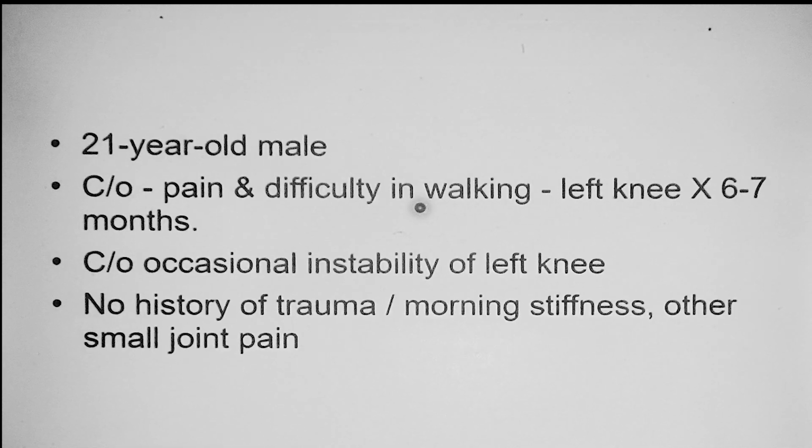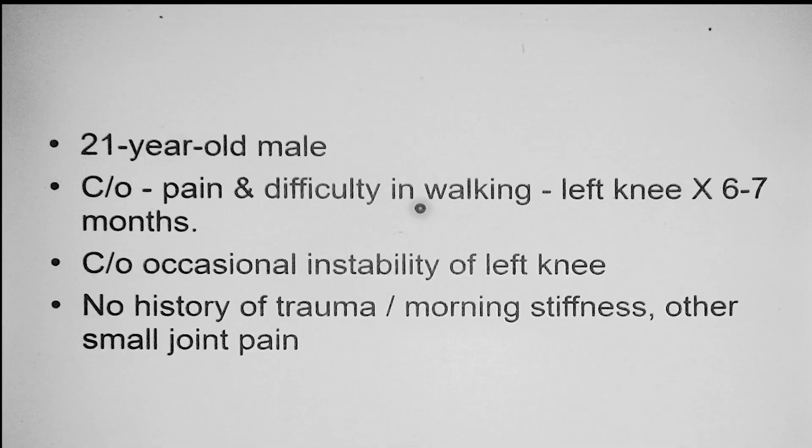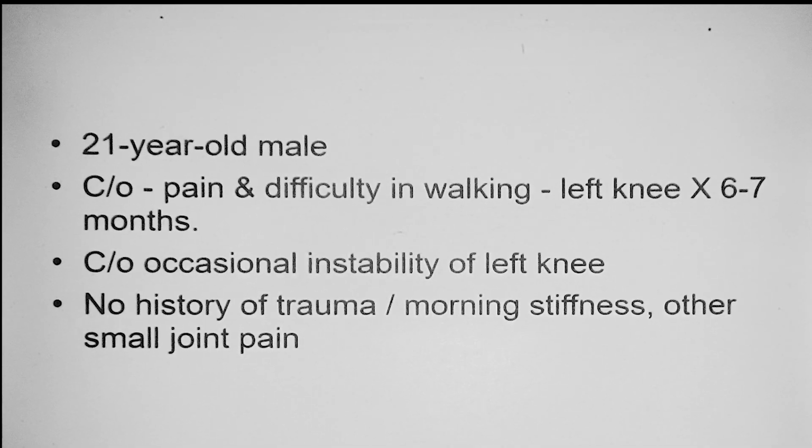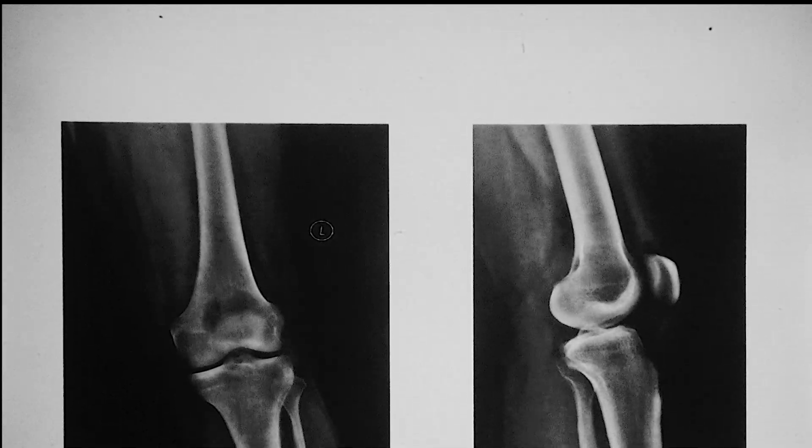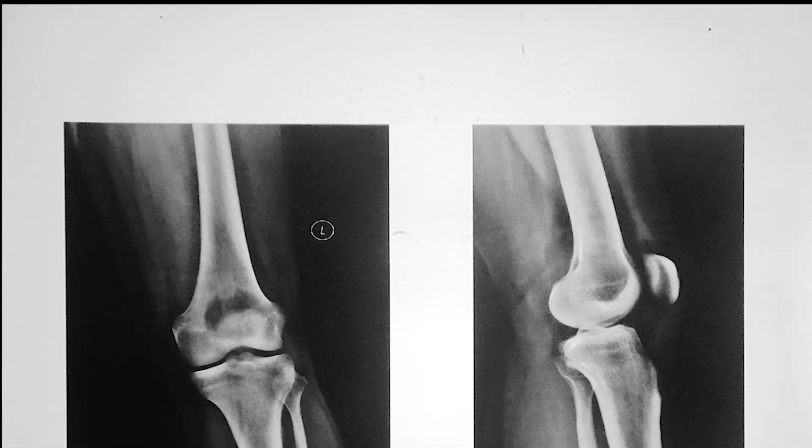Good evening, Your Honor. A 21-year-old male came with complaints of pain and difficulty in walking the left knee for 6 to 7 months, with occasional instability of the left knee, no history of trauma, morning stiffness, or other small joint pain. This was the radiograph, AP and lateral, of the knee joint.